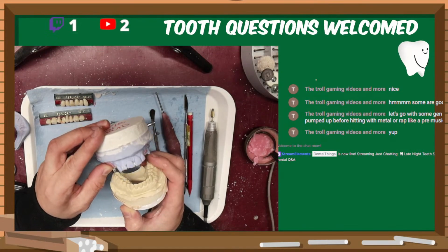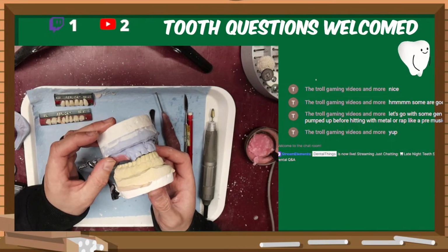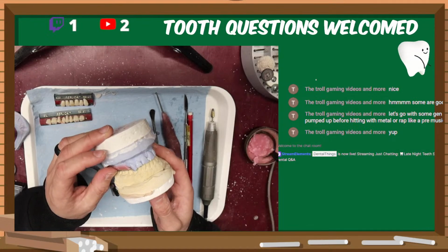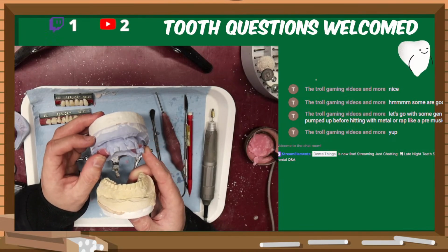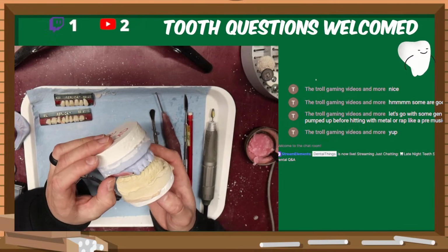If I make one of these, I'm gonna have to pop through every single one of them. Alright, well.